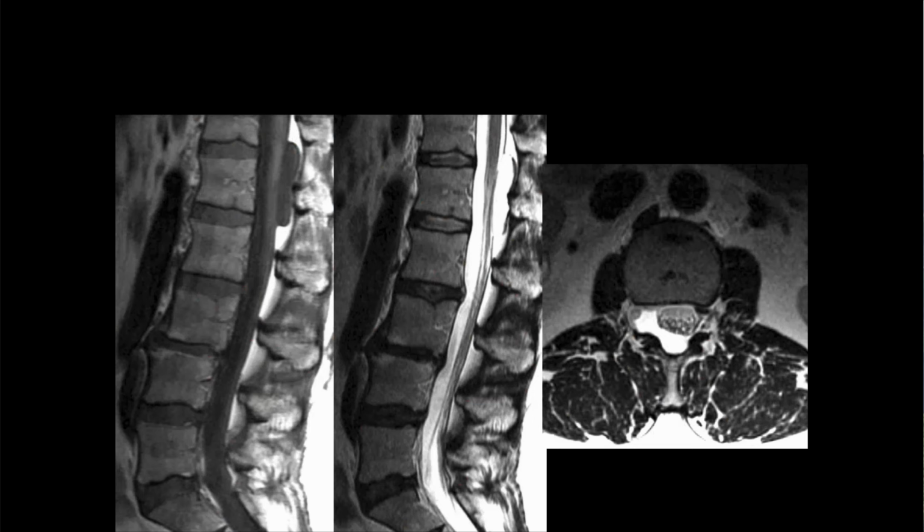Okay, Payson. All right. So, yeah, the sagittal images look like there's an epidural cyst there. That's a mass effect from posterior to the spinal cord. You can often get posterior, and these are arachnoid cysts. Again, most of them are not symptomatic.